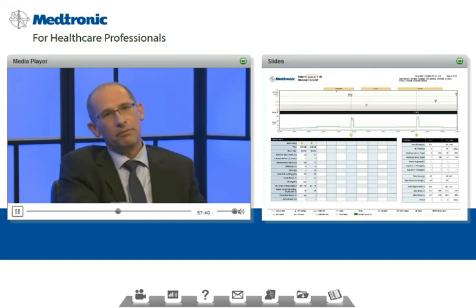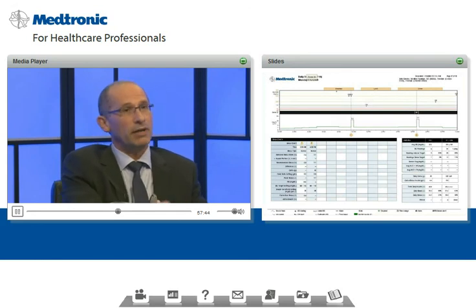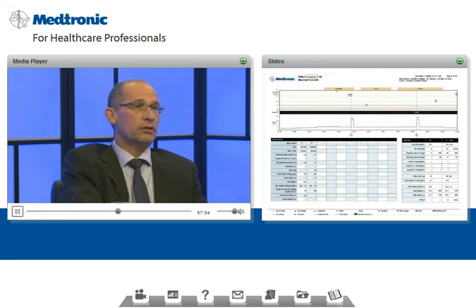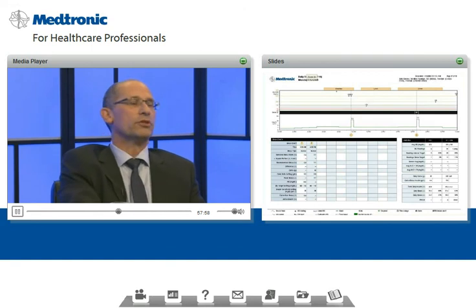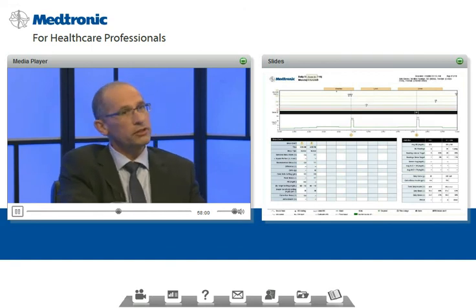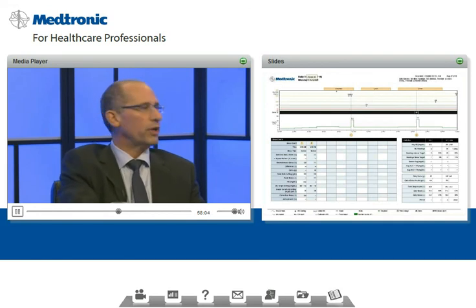So here is an example where the patient is bolusing, bolus number 1. He woke up late. He did not eat breakfast, but his blood glucose was high. And he did a correction bolus according to the setting of his pump. In this case, the patient was right on target. After doing just the correction, he went down after 2 hours and he was in control, hinting to the fact that here the correction bolus is correct. You don't have to change this.